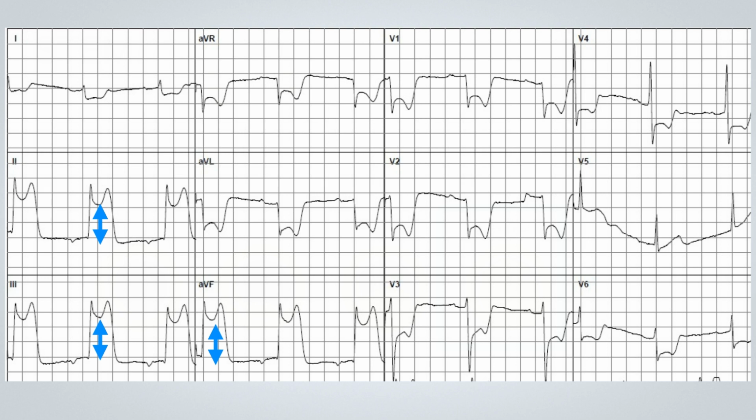The earliest ECG changes observed with acute transmural ischemia or infarction typically occur in the ST-T complex in sequential phases. The complete occlusion of the coronary artery in STEMI and subsequent transmural ischemia require immediate reperfusion therapy to restore blood flow and minimize damage to the heart muscle.